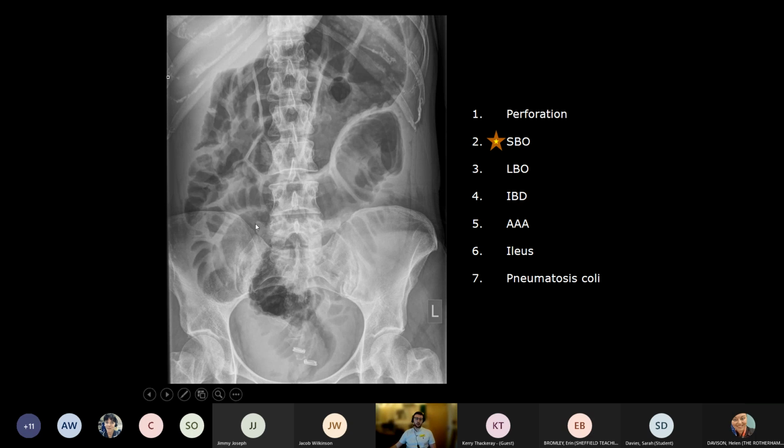It can be hard to separate the wood from the trees sometimes. So is it small bowel? Is it large bowel? It helps when you can see these folds, because you know it's small bowel, and it'll have a tighter radius of curvature.